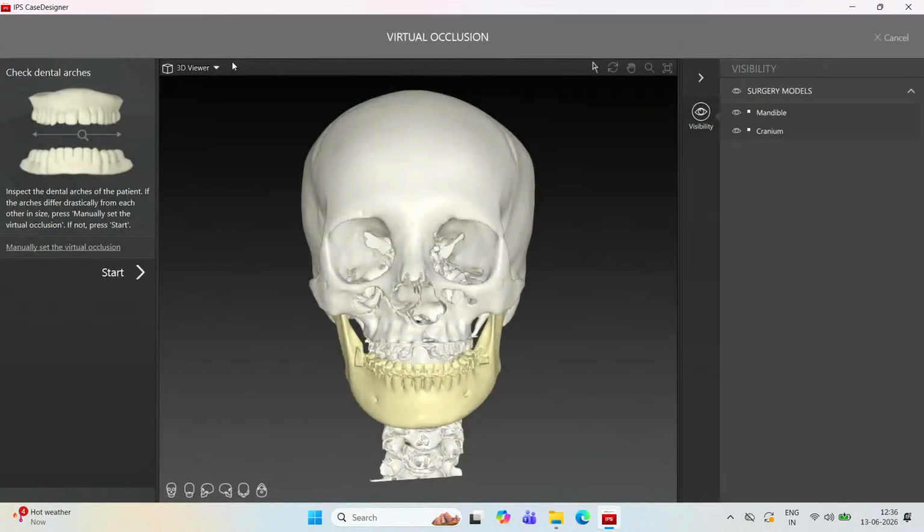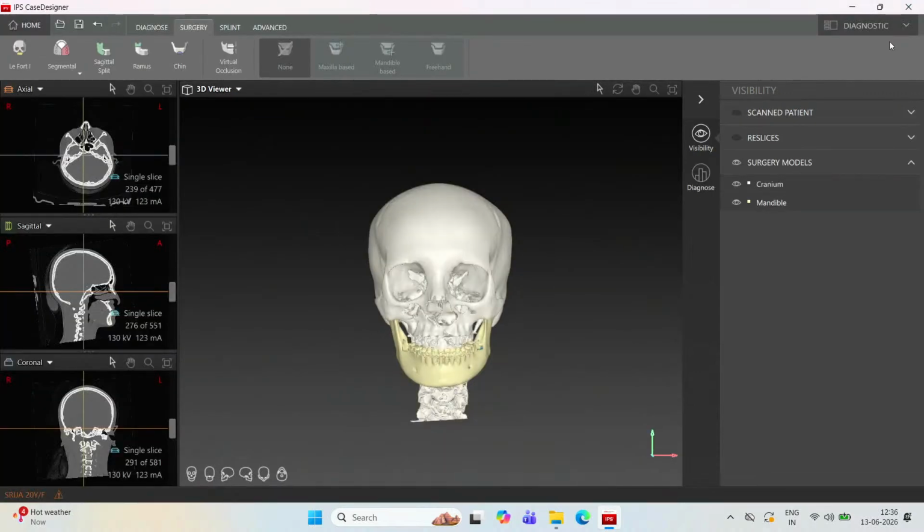So in this, sorry, sorry, how to go there? Okay, fine.